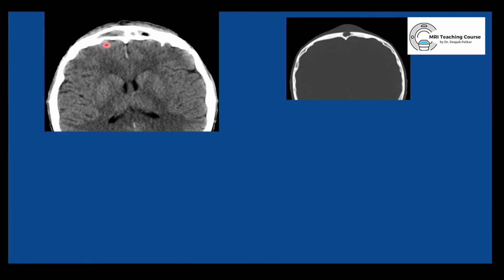Okay, so also you are used to seeing paranasal sinus or sinonasal pathology on coronal. Do see it on axial and sagittal, and do see soft tissue, at least cursor. If your technician is doing the filming, see to it that the soft tissue window, if there is a pathology, is in your report.